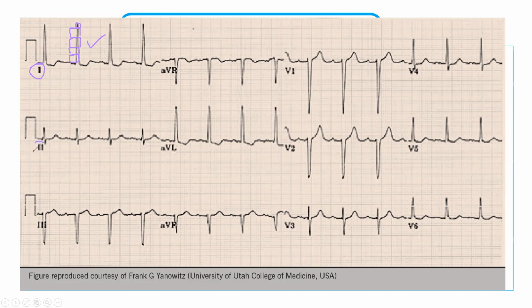Let's look at lead 2. Here, the R wave should be more than 20. This is not 20. Let's look at AVL. AVL should be more than 11 small squares. This is 5, 10, 15, 16, 17, 18 maybe. So this is also left ventricular hypertrophy. And the last one, we look at the S wave in V1 and V2 and take the longest. The longest is here. So this is 5, 10, 15, 20, maybe 25.